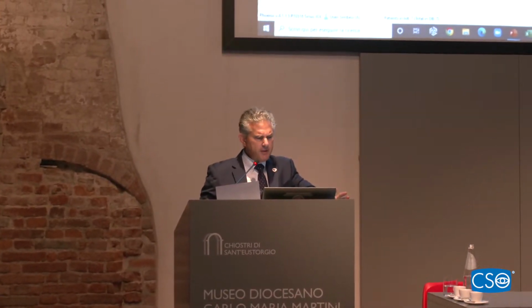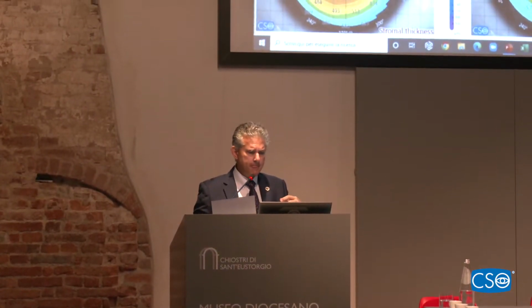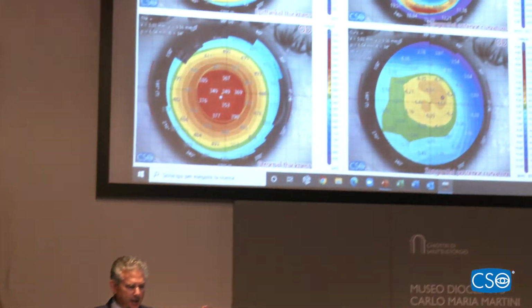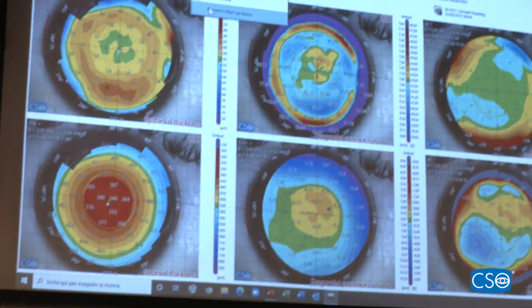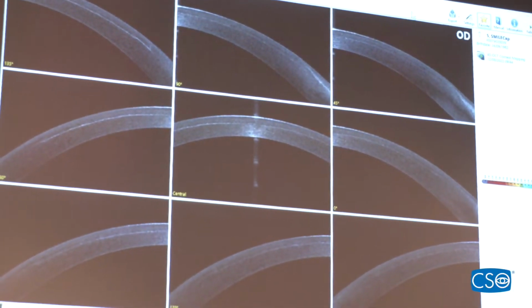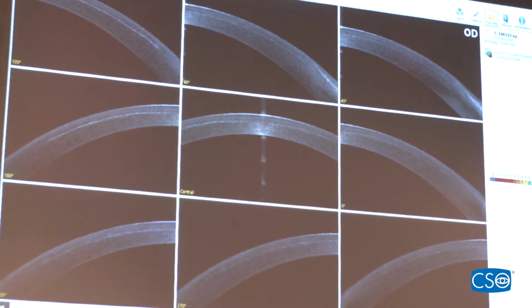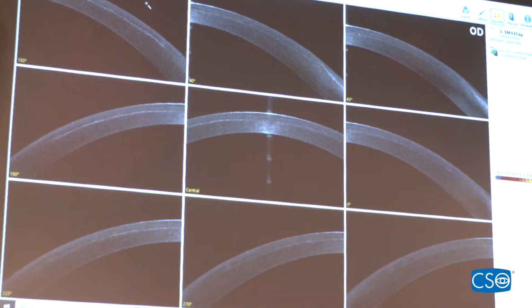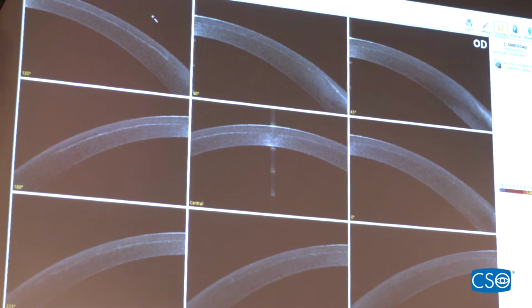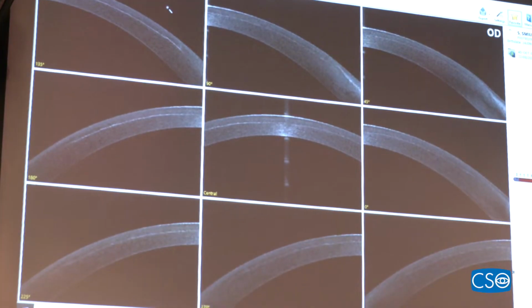Now I want to show you a couple of other things which I worked with Francesco to program here. It's called the Reinstein cap display. With ultrasound, we've been mapping different layers for 25, 30 years now. But the OCT gives us a very quick, very easy way of getting an average idea of where the cap is in SMILE when we want to plan a flap on top.